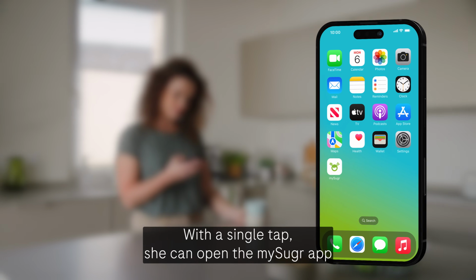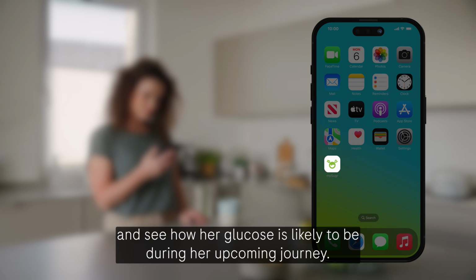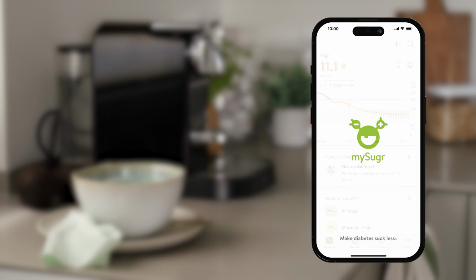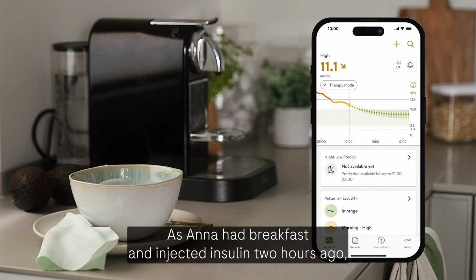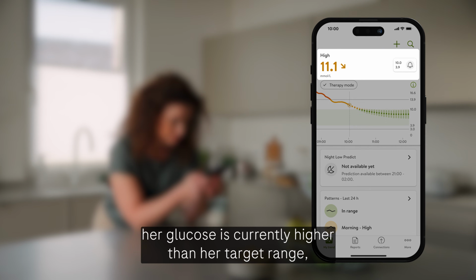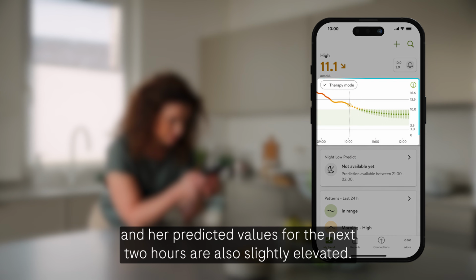With a single tap, she can open the mySugr app and see how her glucose is likely to be during her upcoming journey. As Anna had breakfast and injected insulin 2 hours ago, her glucose is currently higher than her target range, and her predicted values for the next 2 hours are also slightly elevated.